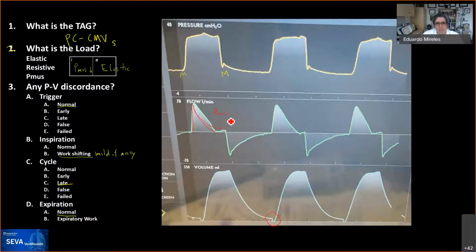And can you think about, usually when you're paralyzed and you have a late cycle, what would be the indications to have a late cycle? And why would you make the patient have a late cycle? Well, it'd be akin to an inspiratory pause in a volume control mode. So maybe if you were trying to provide a short time for further gas exchange to take place. Excellent. Very good. That's one. What else? And team, please, if you feel nice on writing any other thoughts on the chat. But yes, one of them is definitely gas exchange.